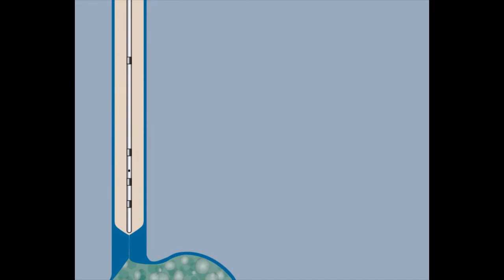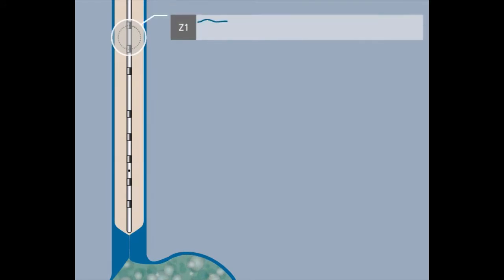To improve the measurement technique, we add rings to the catheter. Between the two rings, the impedance is measured. In rest, the measured impedance reflects the impedance of the esophageal mucosa. Let's have a look at channel 1. What happens with the impedance when liquid is swallowed?